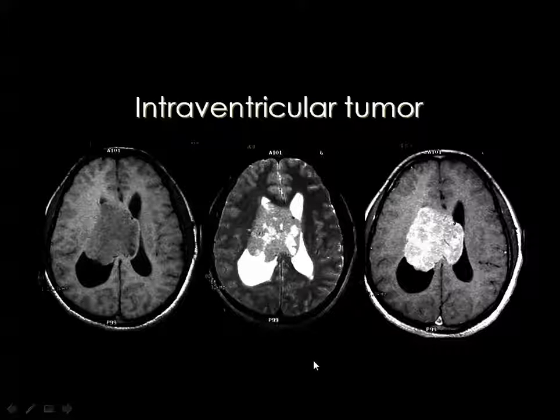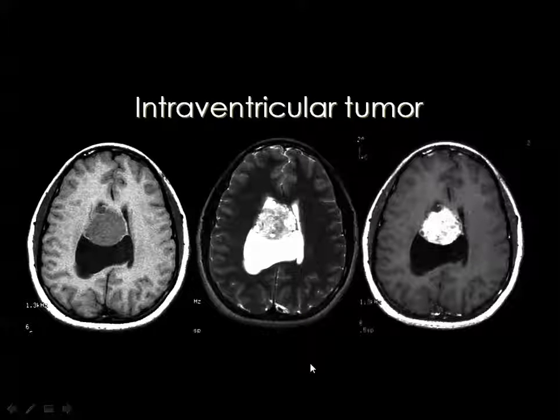And you know that ependymoma in adults will occur in the supratentorial area, while in the pediatric age group it is frequently seen in the region of the fourth ventricle.